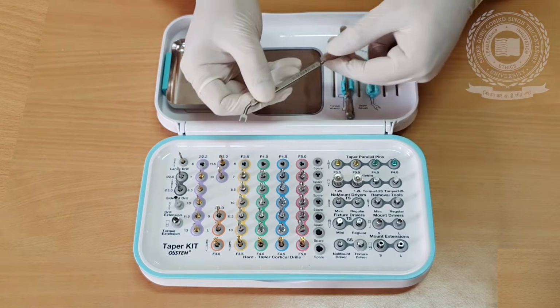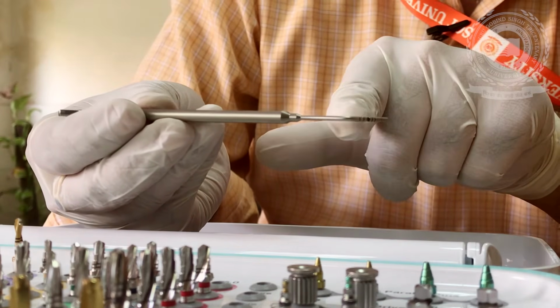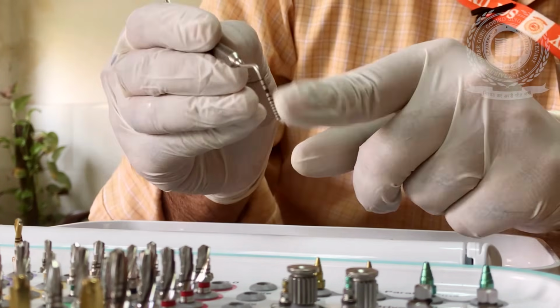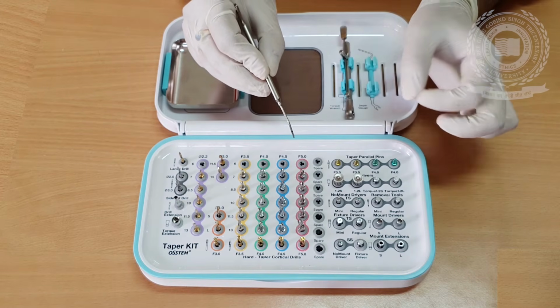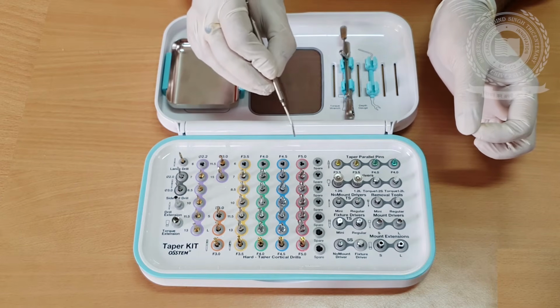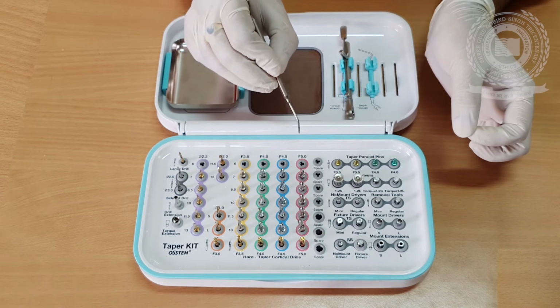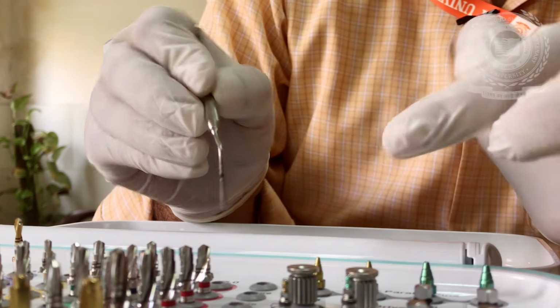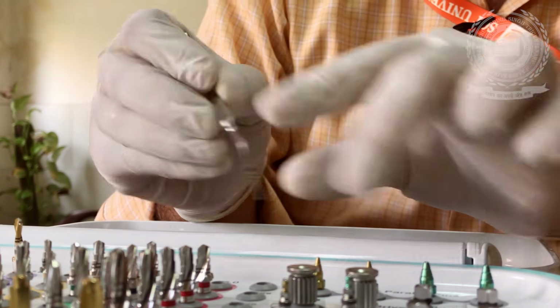Now I want to explain this gauge. This gauge has two ends, one is marked and one is this. This gauge is used to see whether the osteotomy site is intact or not. Suppose we have created one initial ditch, we can place it and move it so that we can get an idea with a tactile sensation that bone is present all over the cavity. If there is a little soft tissue, this means that we have gone in the wrong direction. So this end we can use to have a tactile feel within the osteotomy site.